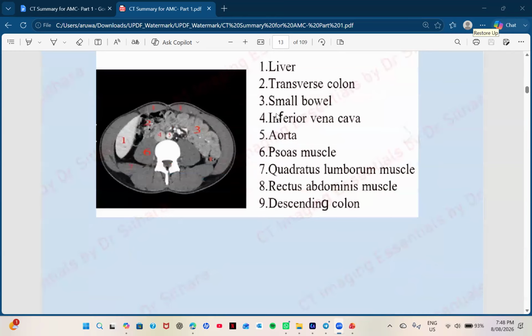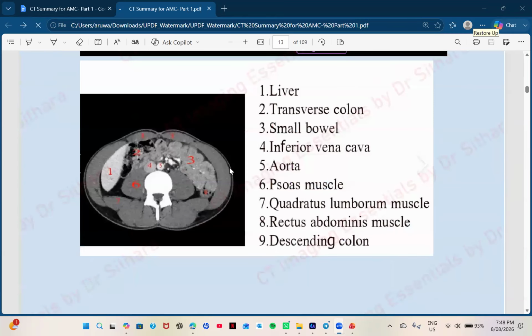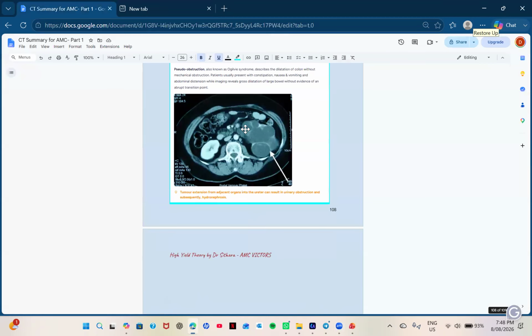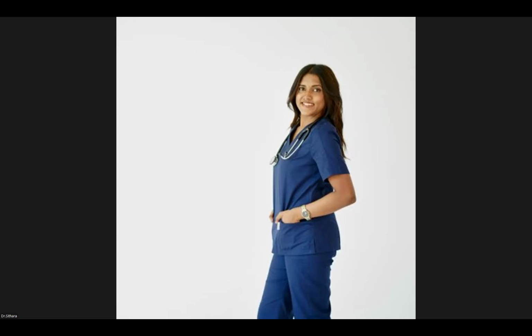And here, okay, now try to... okay, just one minute. It has gone. I have to open it again. Sorry. Okay, no, this one. Okay, okay.